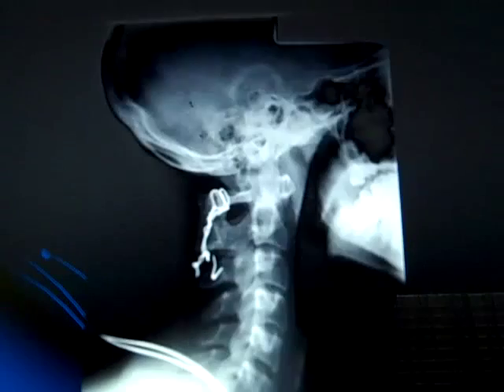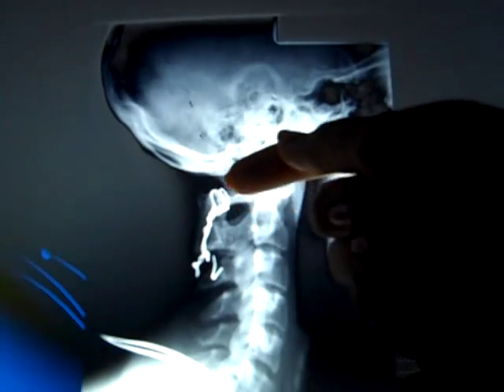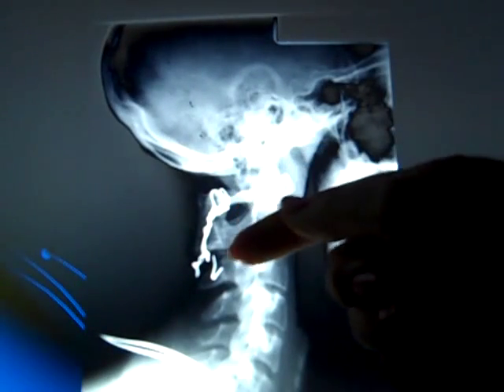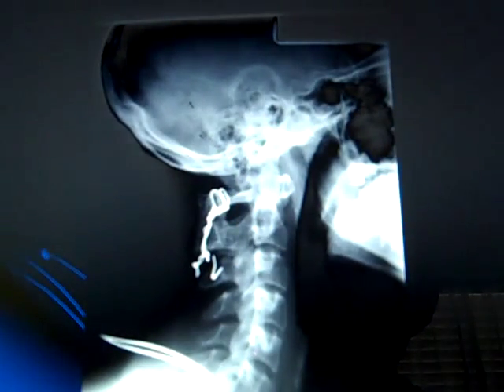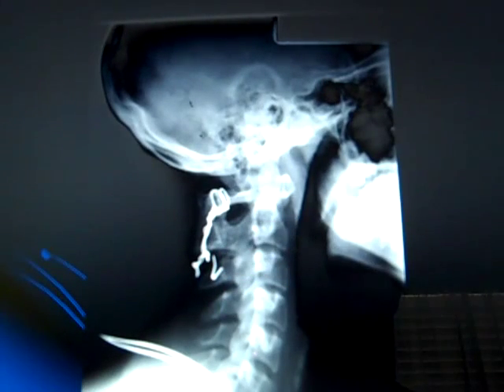And then I also wanted to show you this one. Sometimes they use metal to wrap around the different segments to stabilize, and so this one they've used the bendable wire around the posterior arch down to the lamina spinous process of C2. The only problem is that apparently that piece of wire has broken off. This concludes the tape on blocked vertebra.